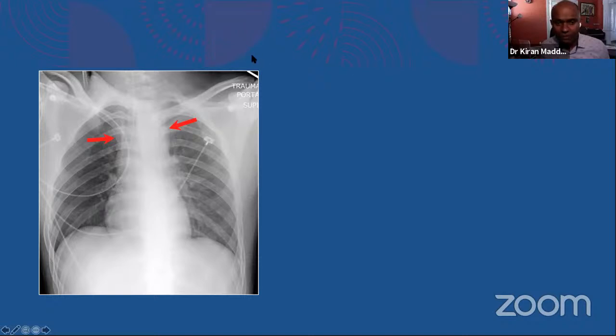Hazy lung, don't talk about lungs for now. We will go there eventually. I'm talking about the mediastinum. I want you to think about what your clinical examination is. Again, notice the trauma, notice the portable supine. What do you do to a patient when somebody comes with breathlessness or some stridor or difficulty in swallowing?